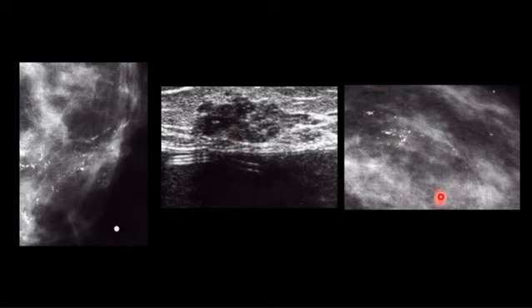This is in a different patient. The MLO view, spot compression view, you can see pleomorphic calcification, linear forms, linear orientation. Okay, you can see irregular distribution. Pleomorphic, there is no one shape. Some are round, some are branching, some are linear, a lot of forms. Okay, so again, if you see this kind of calcification, what BI-RADS do you give it?